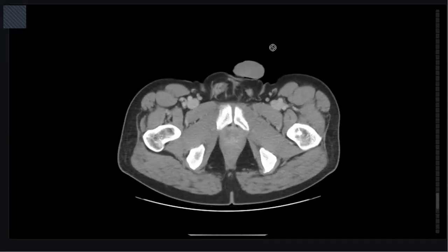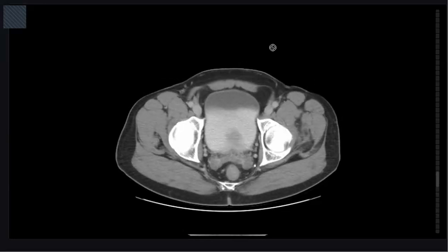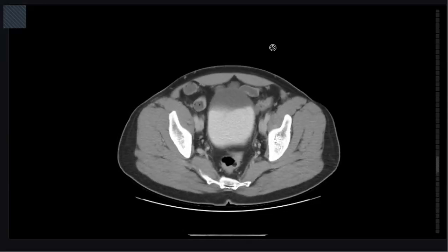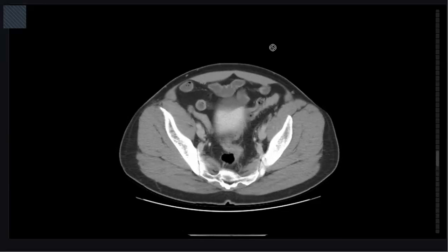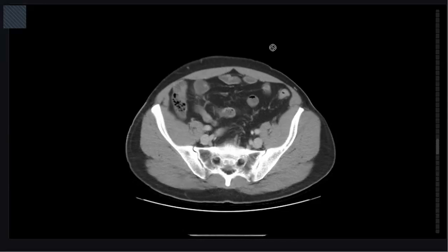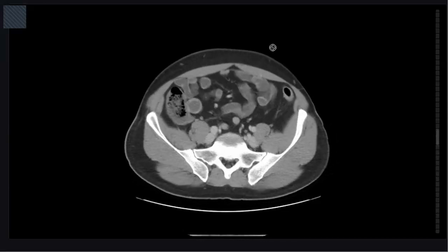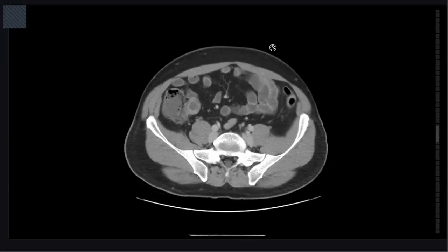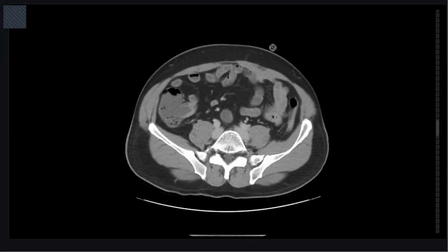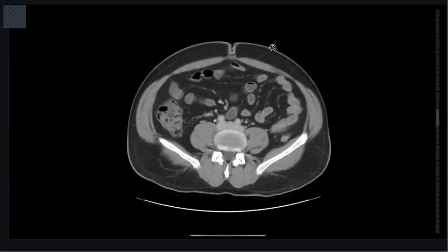I will go back to this area, as I could also detect evidence of cecal dilatation, and also in the right iliac fossa there is mild dilatation of the cecum. Anything else about the bowel, please?